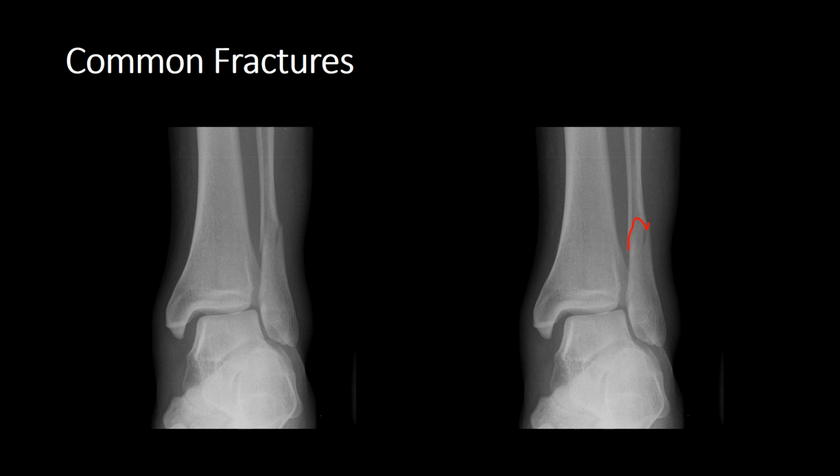Now we don't use orthopedic classification in image interpretation. There's only one orthopaedic classification that I can think of that we use, and that's for the acromioclavicular joint, so we're not going to discuss that now. But you don't need to comment on Weber classifications.